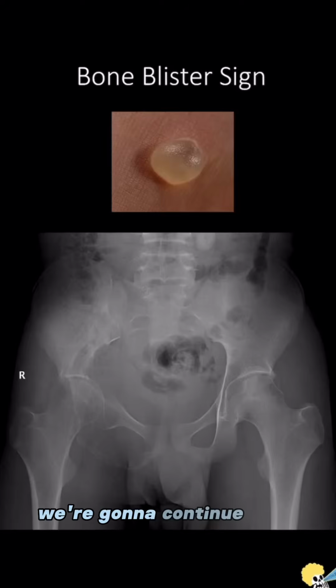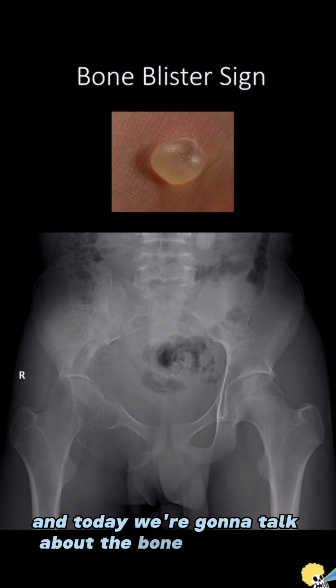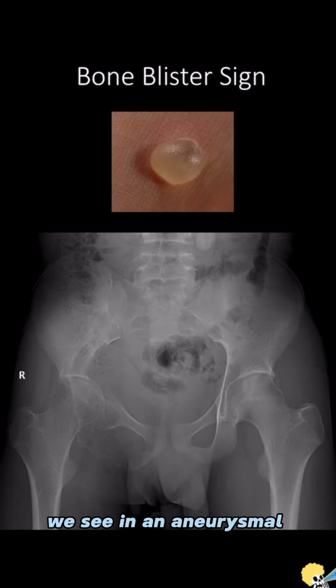Hello, today we're going to continue with our radiology MSK sign series, and today we're going to talk about the bone blister sign. The bone blister sign we see in aneurysmal bone cyst.